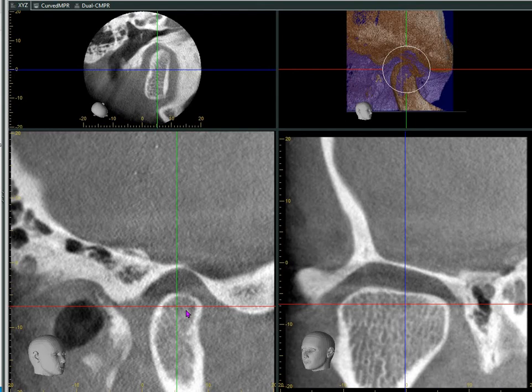This is represented by the dark color separating the top of the condyle, top part of the lower jawbone. This 5 millimeter of tissue space has to be seen around the entire joint for it to be considered a normal joint. This is similar to a moat around an old castle. Any loss of space is considered abnormal.